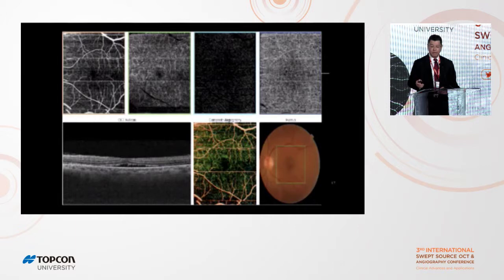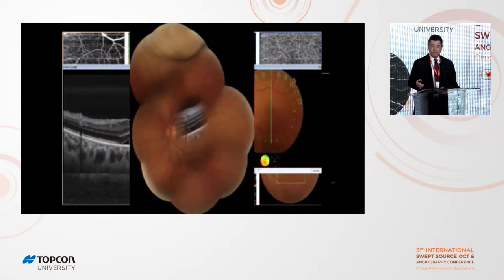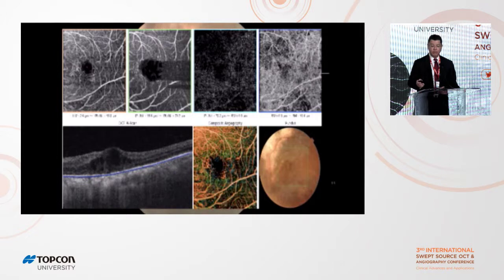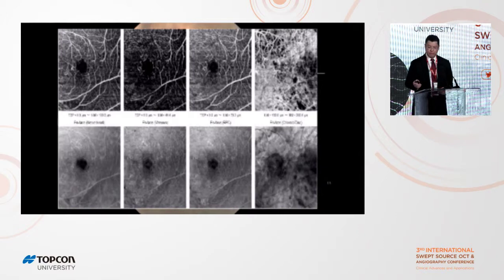We can see here a patient with subretinal fluid, again in this image, and this is before treatment. And then after treatment, whether it is with TTT or with plaque therapy, we can see that patients can develop macular edema associated with radiation retinopathy. And here we can see, associated with radiation retinopathy, the presence of these telangiectatic vessels and microaneurysms, again characteristics of the disease.